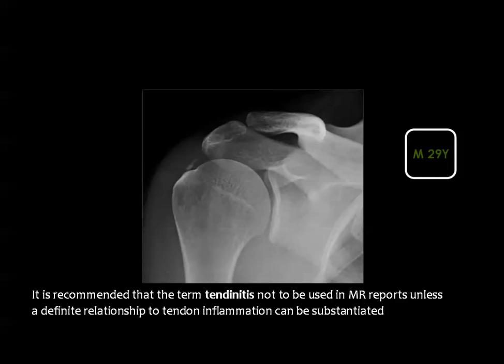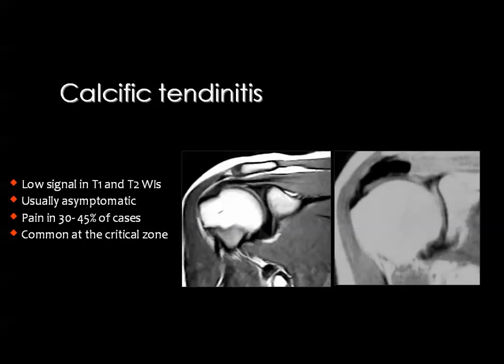Then if there is calcium within the supraspinatus tendon, and this is known as calcific tendonitis, then calcium is best appreciated by the plain X-ray and the reformatted CT images, and is somewhat difficult to be identified in MRI, because you know that calcium will show low signal in all pulse sequences, and also the tendon normally show low signal in all pulse sequences. And this is the normal supraspinatus tendon, which is of uniform caliber and regular outline.